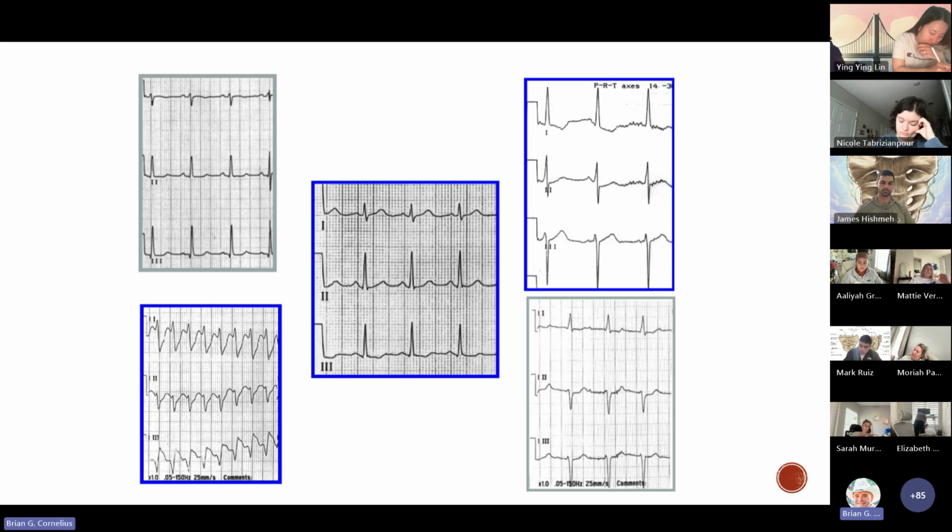Mark asked about hemiblock. We're going to take a look at the conduction systems through the ventricles in just a minute and hopefully explain that really well, because it's a little bit easier to understand when we're actually looking at it. So if we look at that and it still doesn't make sense, just let me know because it is really confusing. And until I started learning about 12 leads, I had no clue all the potential damage I'd done to people by giving some medications. So it can be kind of a warning sign for you, and it makes giving little things like lidocaine a little bit scary.